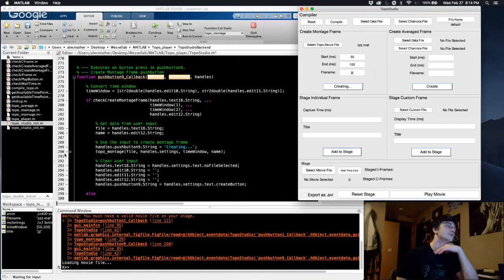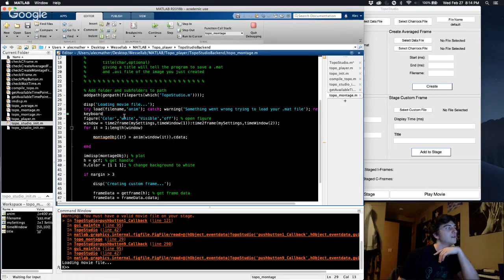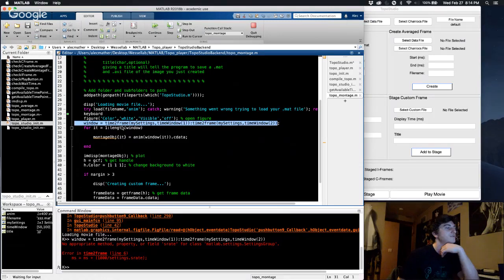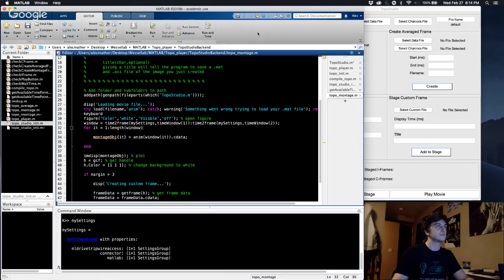Now watch. We're passing in the right thing now, and if I keyboard in here and do this, my settings is still that. I think I just need to restart this whole thing.